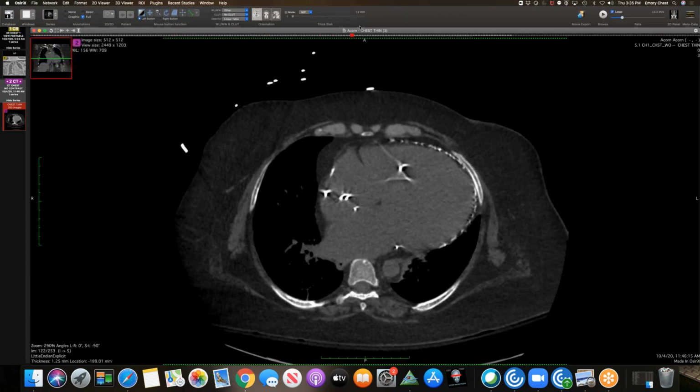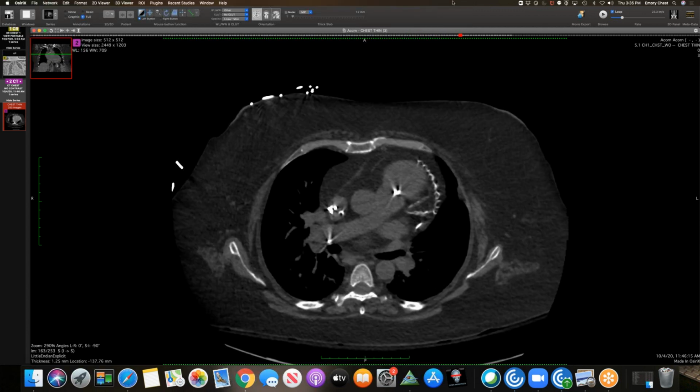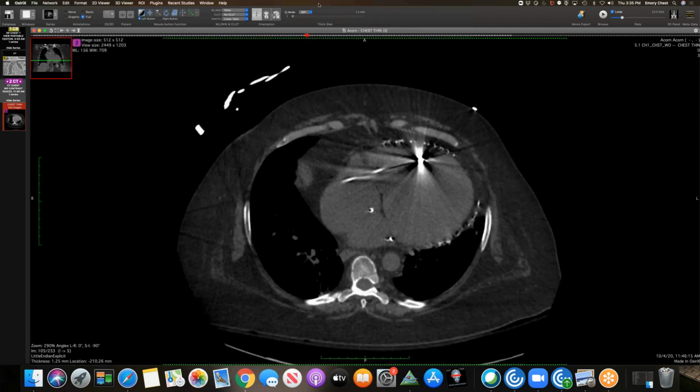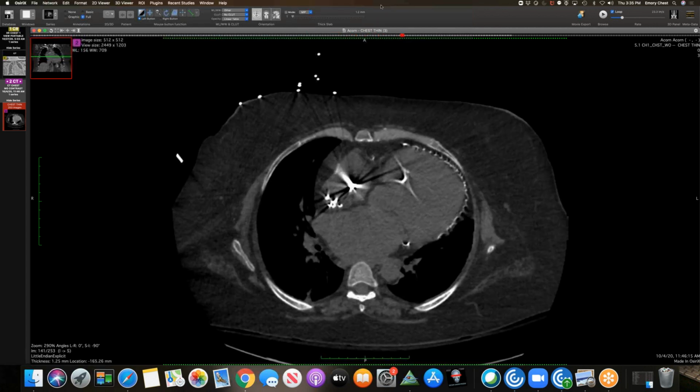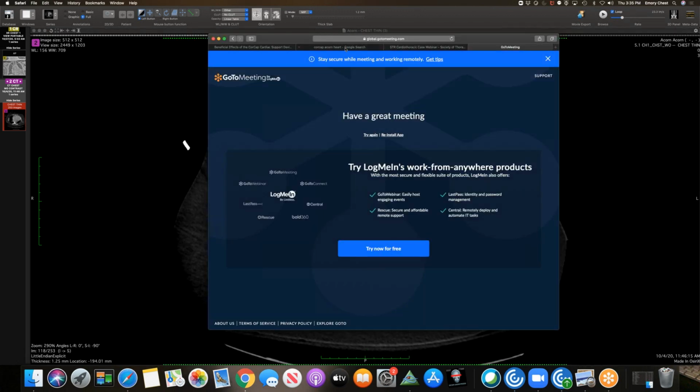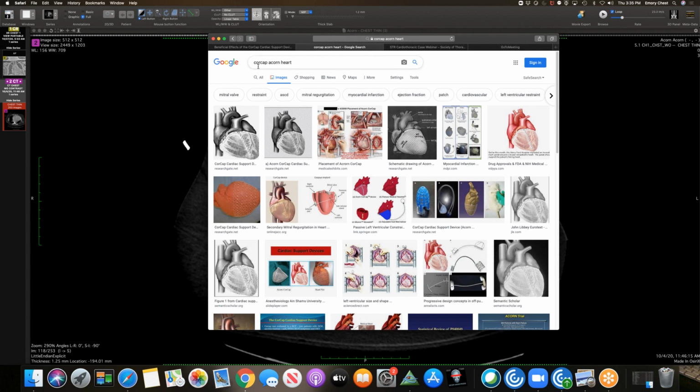Okay, this could be an inflammatory response to silicone. Well, it's interesting you say that, David, because the pulmonologist said that when they did a right axillary lymph node biopsy, they ruptured her right implant back in the 90s. And they excised some lymph nodes at some point that had silicone in them. And so the question was, could this be silicone? And that was one of the things on their differential.